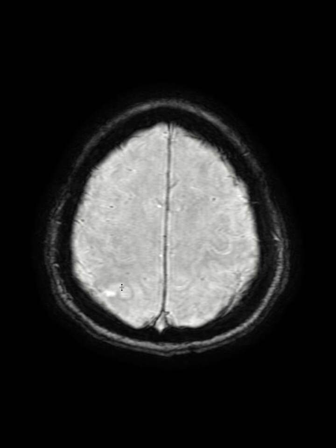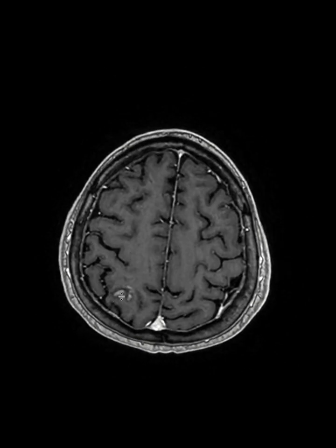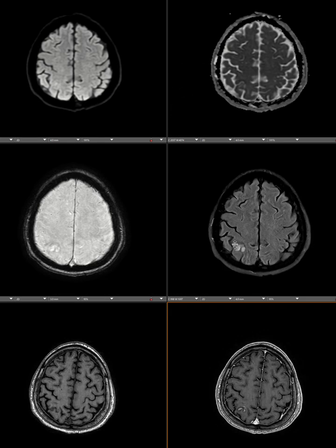And then we don't have hemorrhage. This is the susceptibility weighted imaging. But on post-contrast sequence, in those areas, we see areas of enhancement. So this is gyriform enhancement in those areas. The cortex is enhancing, and it has T2 FLAIR hyperintensity. This is the phase of subacute infarct.